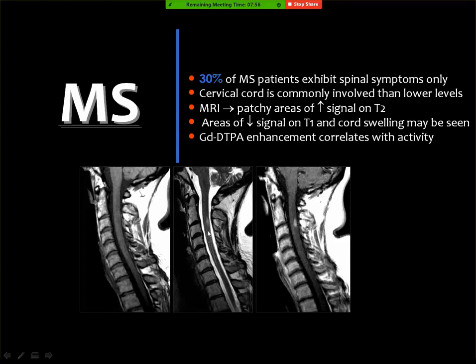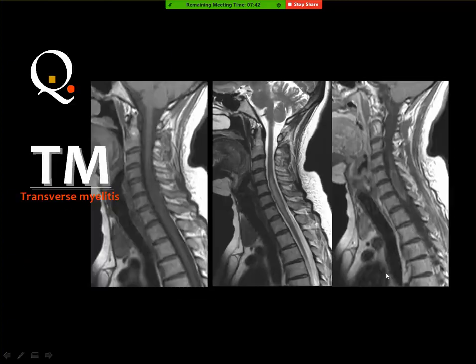And intramedullary lesion for differential diagnosis, not this, the previous one, the question. Yes, MS is an intramedullary lesion, actually. No, doctor, about transverse myelitis. Yes, the diagnosis of transverse myelitis. Yes, you should say for comment, this is an intramedullary abnormal signal extending from so and so, and it shows low signal in the T1 and the bright signal in the T2 weighted image. And for differential diagnosis.